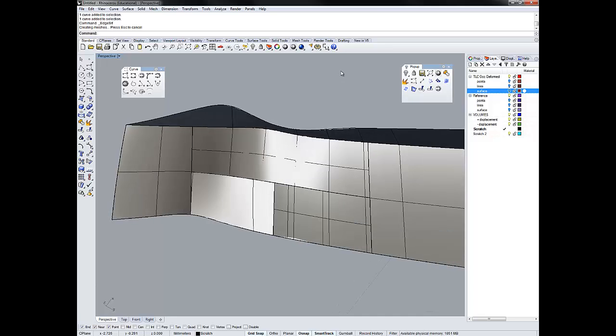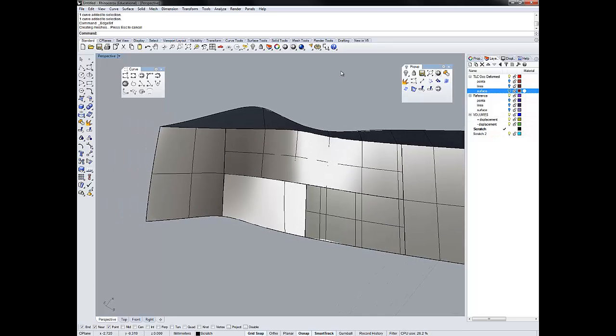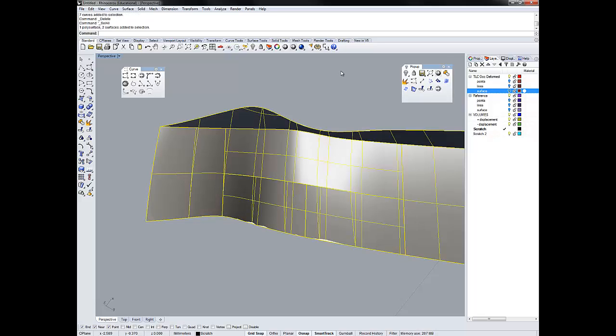And at this point, I've tried 3 or 4 different times to fix this, and it hasn't been fixed, so I'm not going to worry about it. I'm just going to move on. So this is how it goes. It's just a visual indication that there's a geometric inconsistency. It's not necessarily going to affect our results or give us an incorrect answer. It's just due diligence. So here we go, and I'm going to select all my curves and delete them, and then I'm going to select everything and join.